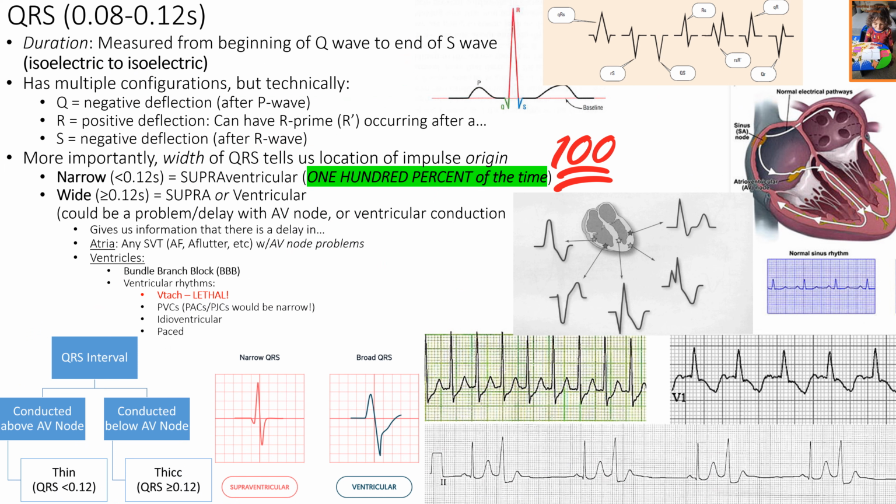All right, so the QRS is 0.08 to 0.12. We don't really care if it's less than 0.08. What we care about is if it is longer than 0.12. Some people might argue and push up their glasses and say, well, 0.10 to 0.12 is also concerning. That's a sign of ventricular delay. But really, greater than 0.12 is where we are concerned, right? That means the QRS is getting bigger and bigger and bigger. That means it's taking longer and longer to get through the 405 and 5 freeways here, right? Either there's a bundle branch block or there is something that's depolarizing and causing a wide complex, such as a ventricular tachycardia, like a PVC or a VTach, that's causing abnormal conduction through the heart, okay?